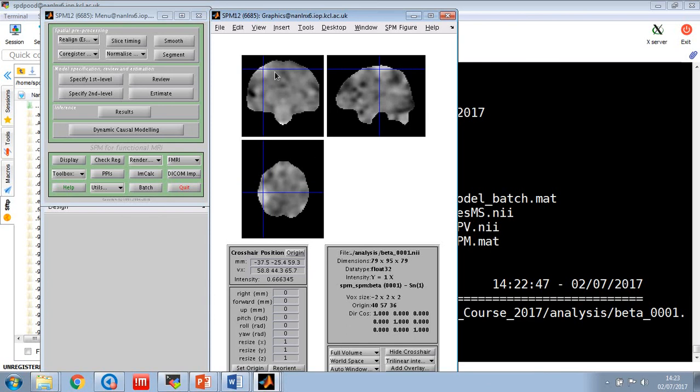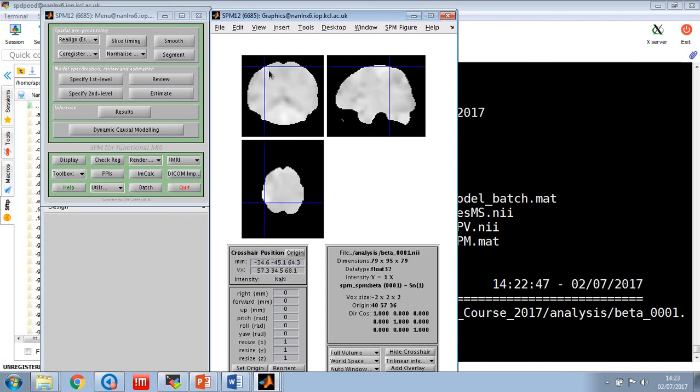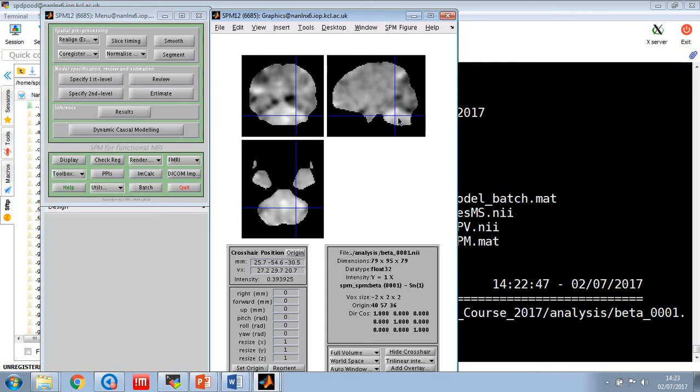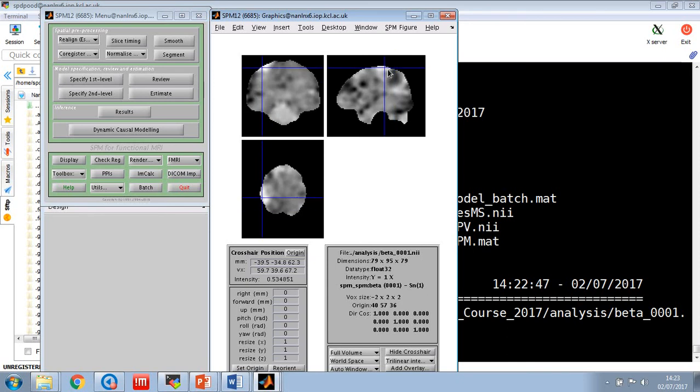Okay, so the betas are higher here than they are in most of the rest of the brain. Cerebellum will also play a bit of a role as well. And let's see, the betas are highish there as well. Because people move, when they move their right hand, you see ipsilateral cerebellum, so the right cerebellum, which is what we're seeing, these higher values, and contralateral motor cortex, which is what we're seeing here. Okay, so in essence, it's fine.